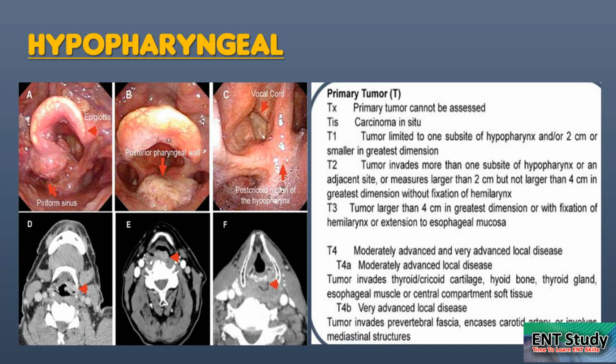The mucosa should be thin. If there is any asymmetry, particularly if it is enhancing and irregular, this is abnormal. If it is eroding the adjacent bone, abnormal. Always keep comparing both sides. And then check whether there is an intact, clean, black space alongside it or not, and whether there is anything grayish popping up into that clean black space.